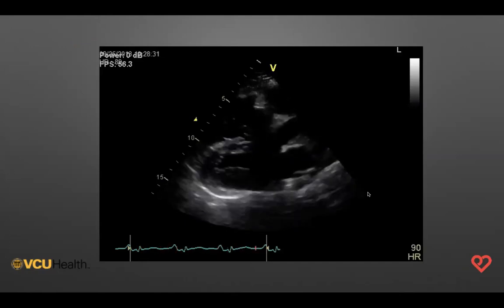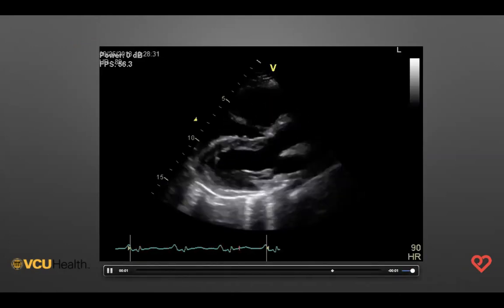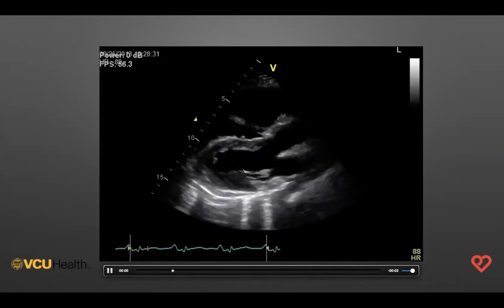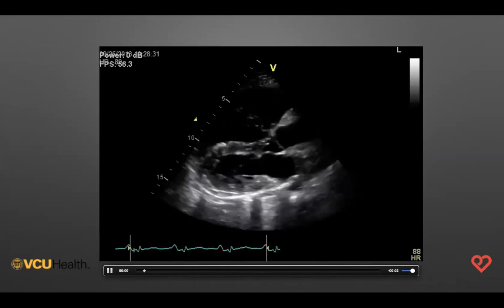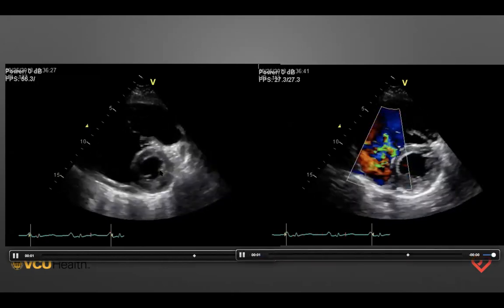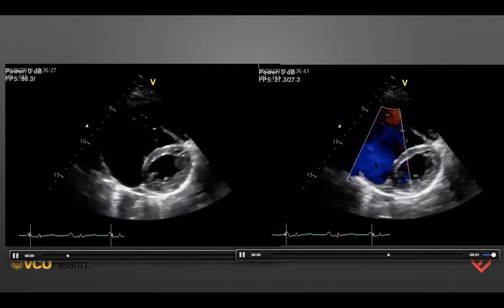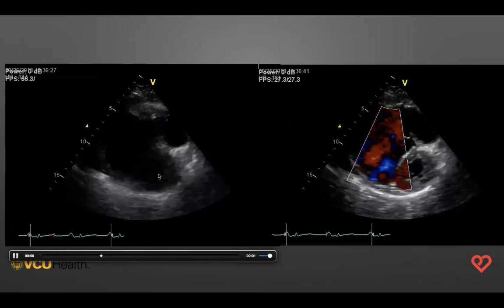I think on this parasternal image, what you first notice is that the tricuspid valve is in plane. And so you have to investigate further why is that? LV function is reasonable. The septum has a funky abnormal motion that doesn't fit any strict criteria on this image. Here are two short axis images, which help us to show an enlarged right atrium, the abnormal tricuspid valve, which is associated with significant severe tricuspid regurgitation, and a small, normally functioning LV.